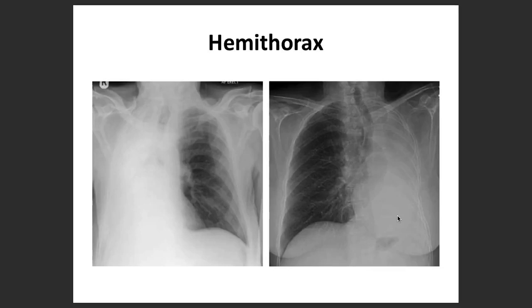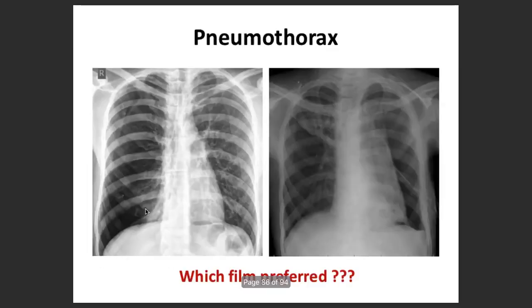And the last one, as I was telling you, remains in the middle. In terms of consolidation, if there is a pleural or chest wall mass, or otherwise some combination of pathologies as well. So these were some of those beautiful examples.